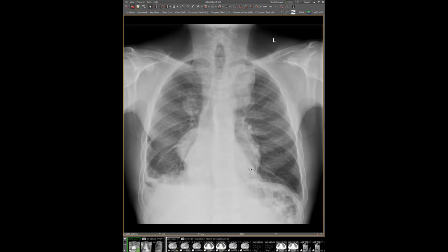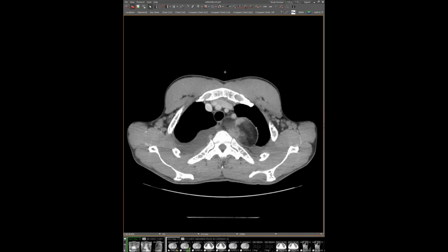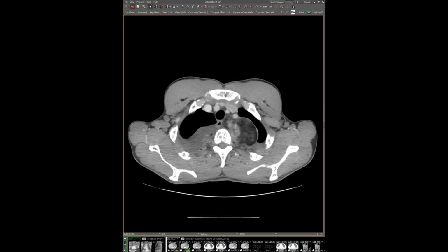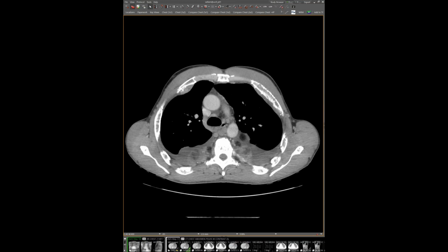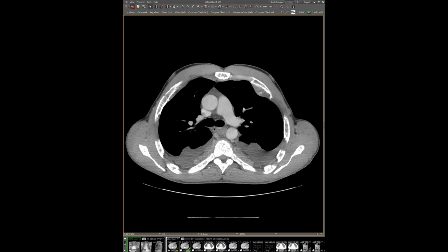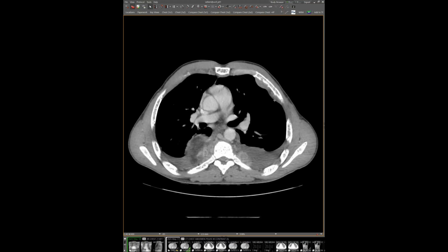So when we're talking about multiple posterior mediastinal masses, the first things that come to mind are going to be neurogenic tumors, and then what this turns out to be, which we do have a CT from. We can see that these masses have quite a lot of fat density intermixed with soft tissue density. There are multiple of them bilateral surrounding the spine. Some of them seem to be associated with the underlying ribs a little bit. We do see some anteriorly as well.